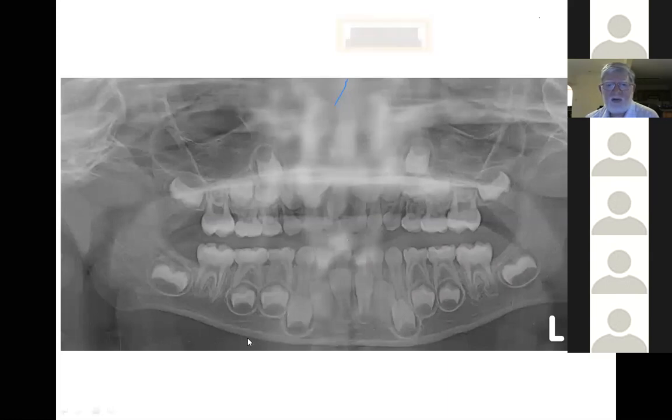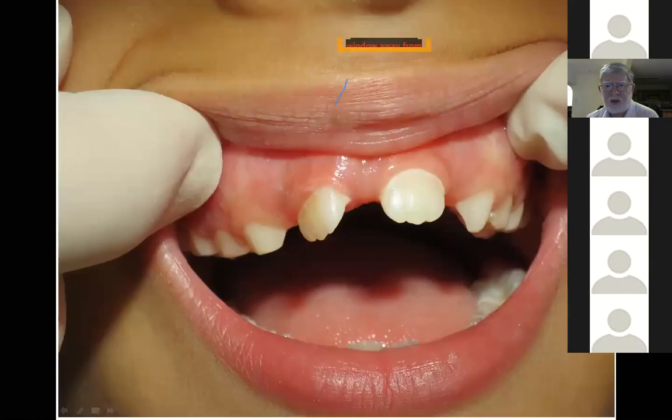Okay, let's count teeth across here. You're looking at 1-5, 1-4, 1-3, 1-2, 1-1, 2-1, 2-2, 2-3, 2-4, 2-5. And that is a supernumerary, a mesiodens sitting there. Commonly sitting in that position is going to be the cause of a diastema, a large diastema there.